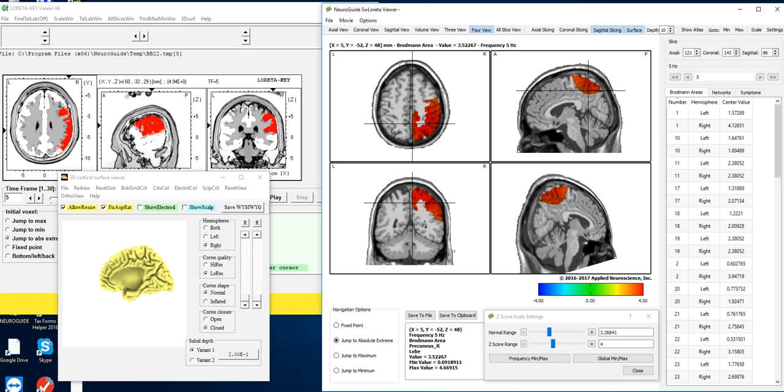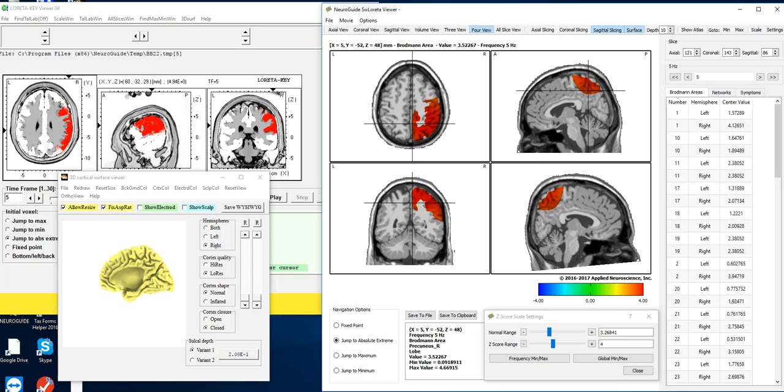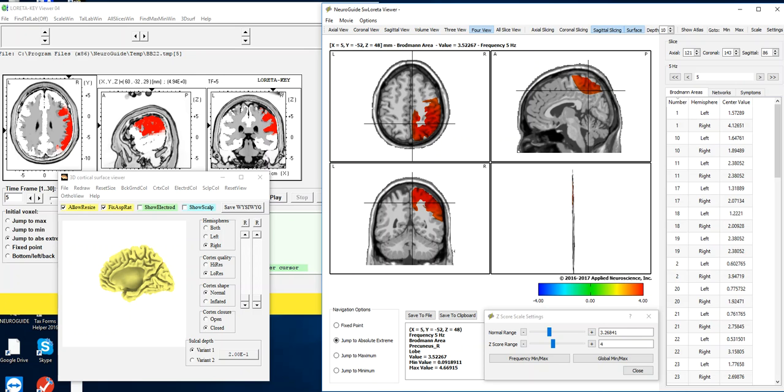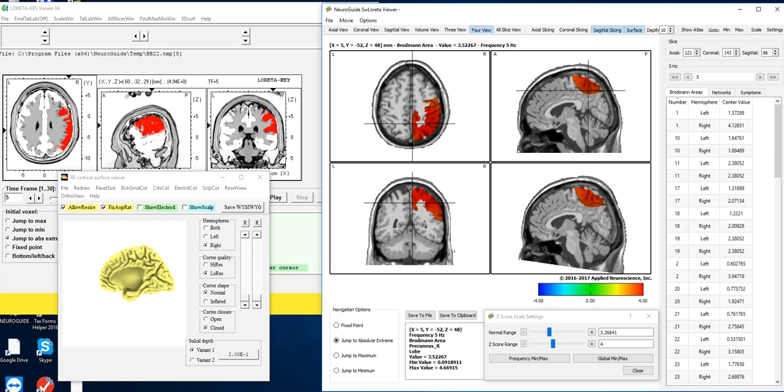And you can't do this with the Key Institute. It's just not available in the Key Institute. It's not a real MRI. And this is the mesial surface looking from the left side of the brain to the mesial surface of the right hemisphere.